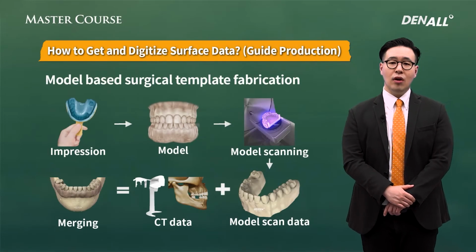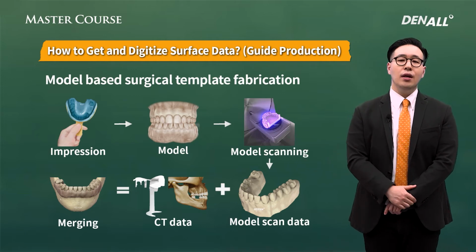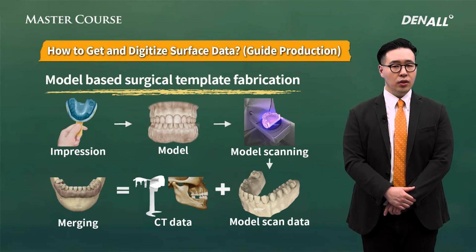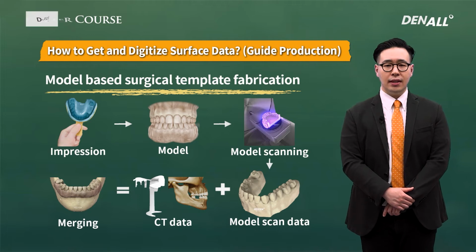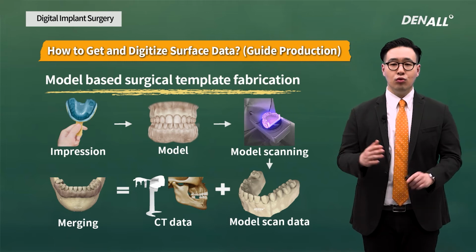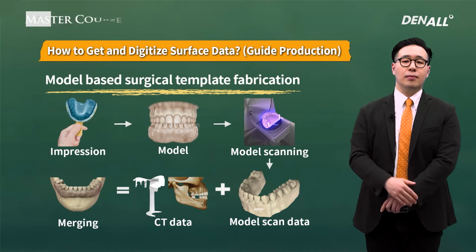And if you don't have an intraoral scanner in your office, after alginate impression taking, a model is made to be scanned with a model scanner. Then analog scan data is converted to digital scan data. When occlusion is completely collapsed or in a completely edentulous patient, first I do impression taking and take interjaw relation, and then I convert the data into digital.